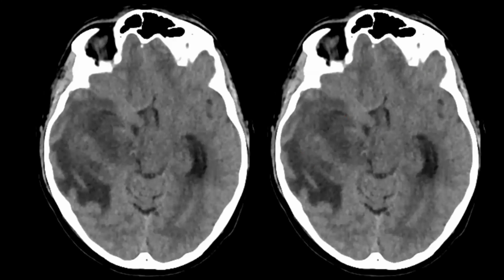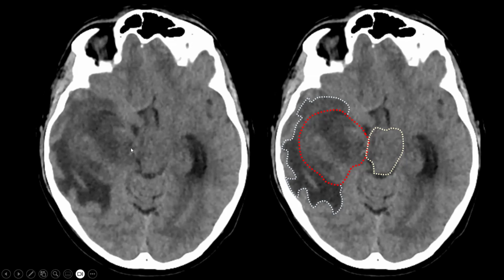Let's take a look at another slice in the same patient. Here is the tumor surrounded by edema. What is this? This is the mesencephalon, or the midbrain. But the morphology is not normal. Why is that? Because it is compressed. And do you know what this is? This is the uncus of the temporal lobe. This is an uncal herniation causing compression.